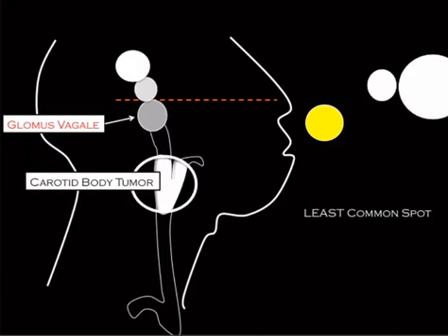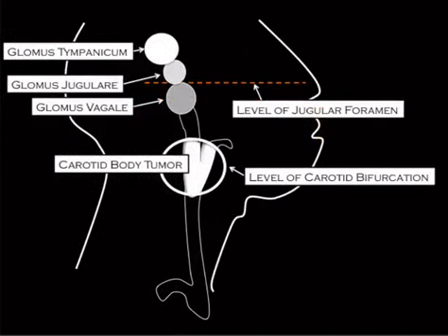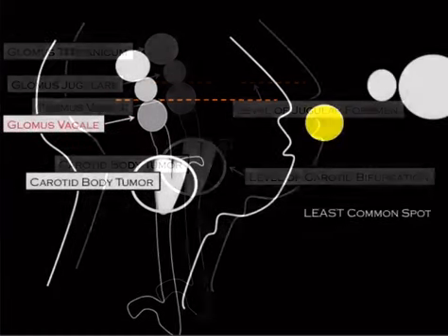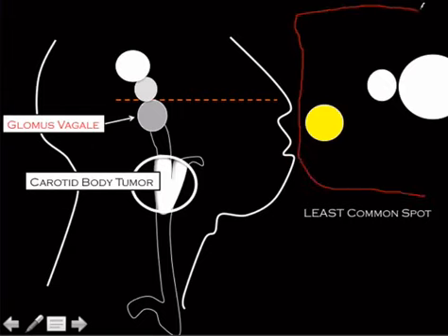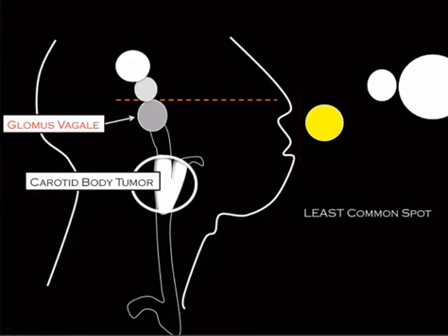So, let's go back to that for a second. I'm going to do something for you that's going to help you out. Otherwise, because I'm a visual person, we're looking in the axial plane. So that's medial, even though it's sort of lateral off the page. This was just the cutoff of the axial plane. So remember that in your brain. Anterior and medial displacement with the thing off to the lateral side.